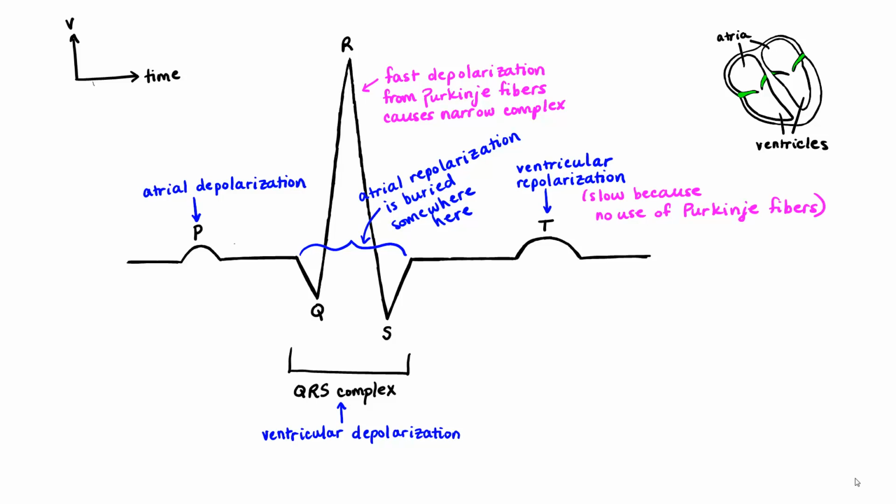Okay, so we understand that. But now I have to tell you that the diagram that I've shown you right here is actually not the full story. It's actually only one out of several ways that an EKG tracing could look. So the reason I've drawn it this way is because this is really the stereotypical image you're going to see when you look up EKG tracing on the internet or in a book somewhere.